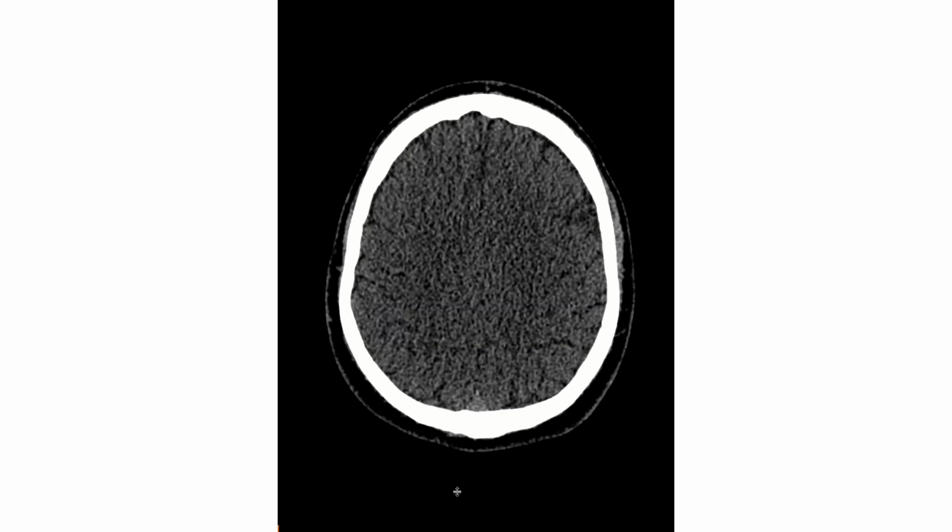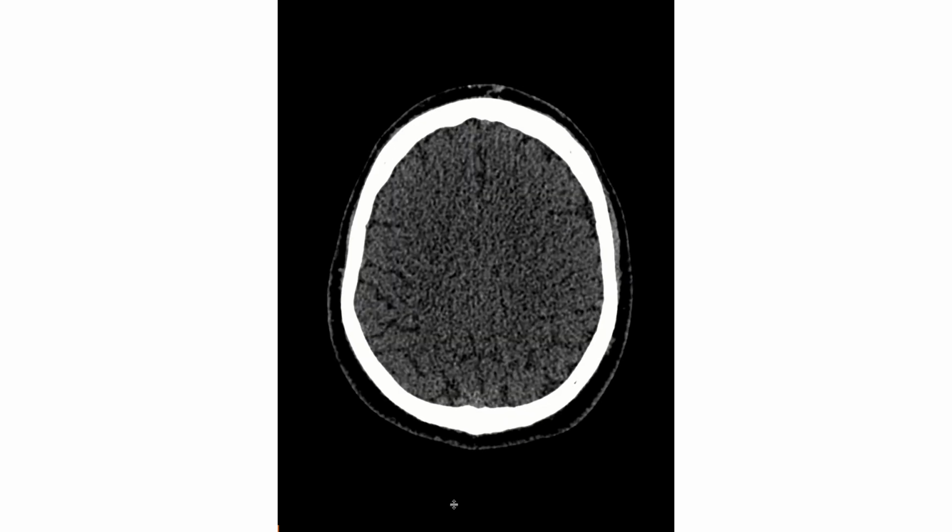So imagine this is a patient, like 20 or 30, coming through the ER with headache. This is a very common indication, a very common complaint in the emergency department. So the common route for these patients nowadays is just getting a head CT. So when we want to look at a head CT, I just want to tell you some principles about the head CT.